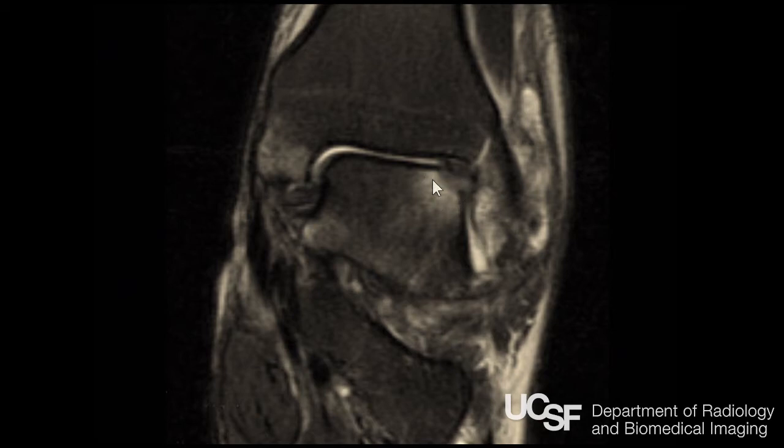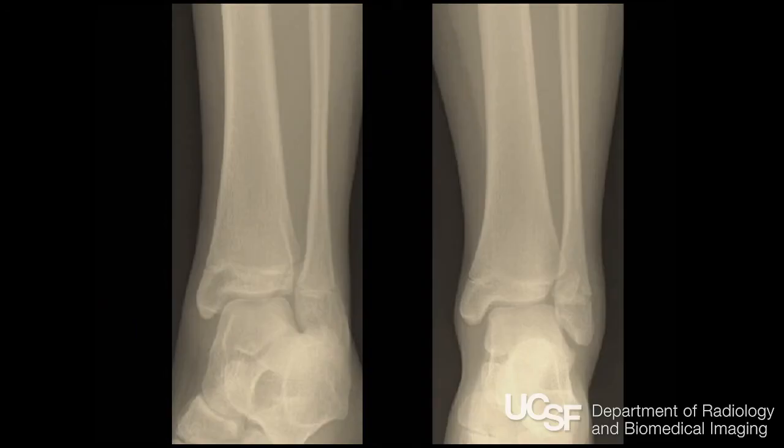Avulsion injuries may not show you much edema. Compression injuries usually show you edema if they're relatively acute or subacute. With the osteochondral defects of the talar dome, there is a tendency for the bone fragment to actually flip upside down. So this is an important injury for you to look for whenever you're looking at ankles.